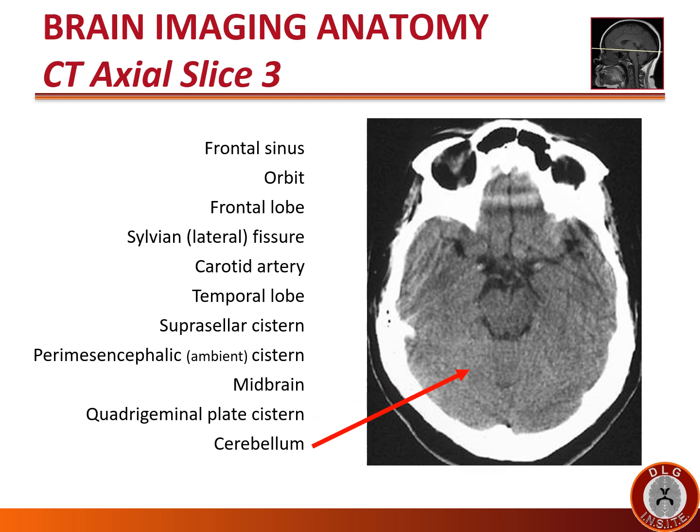The cerebellum lies posteriorly or dorsally to the brainstem still. Note that there is still parenchyma centrally, medially, in the cerebellum. That's the clue that you're not yet up in the occipital area. The occipital area would have a fissure between the two sides. Cerebellum does not. It has parenchyma in the middle, medially, called the vermis.